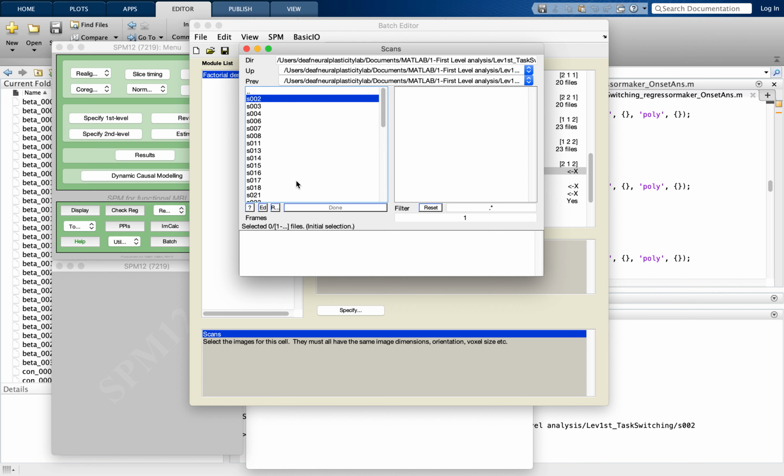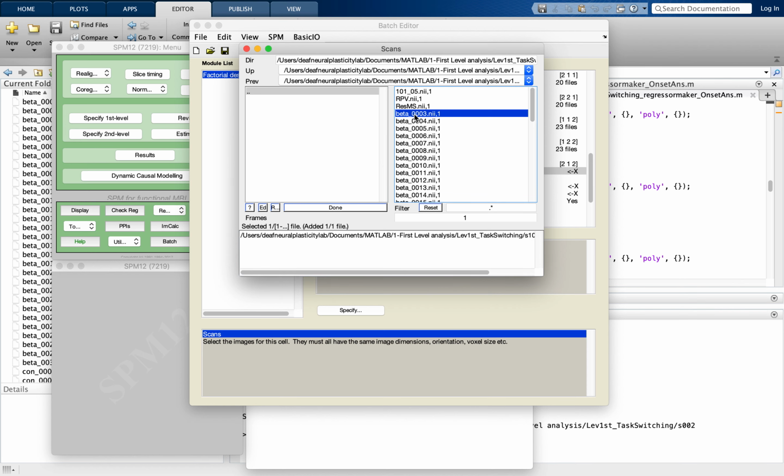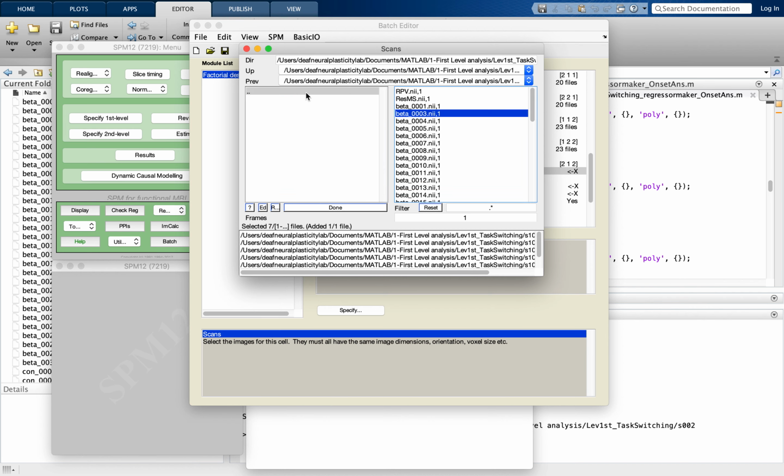So go one by one, 101, which is my first participant, and I select beta 2. Tons of participants. We do one by one.